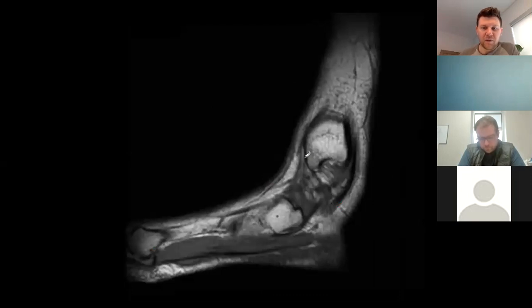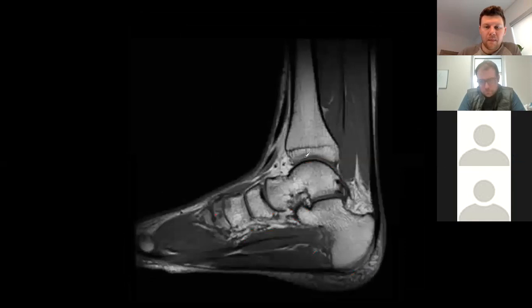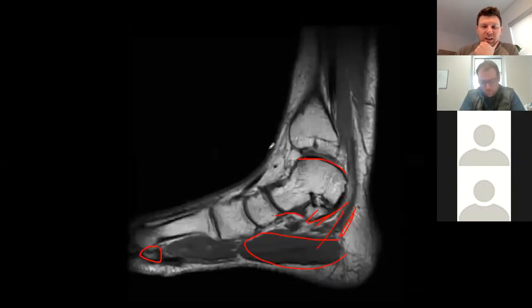All right, last sagittal view. Hey, Dr. Rosante. Yes, sir. Quick question. Could you go back two slides? This one? Yeah. Okay. Is that line on the tibia, is that the growth plate? Yeah, it's a physeal remnant there. Okay, that's it. Good question.